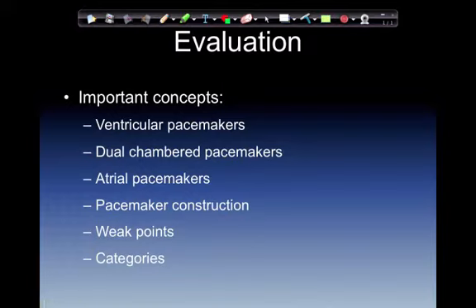Evaluation. Important concepts. Ventricular pacemakers. Now this is if the patient has their own pacemaker. So an evaluation of this: is the ventricular pacemaker capturing? Is it appropriately sending a spike followed by a wide QRS, and does my patient have a pulse with that?